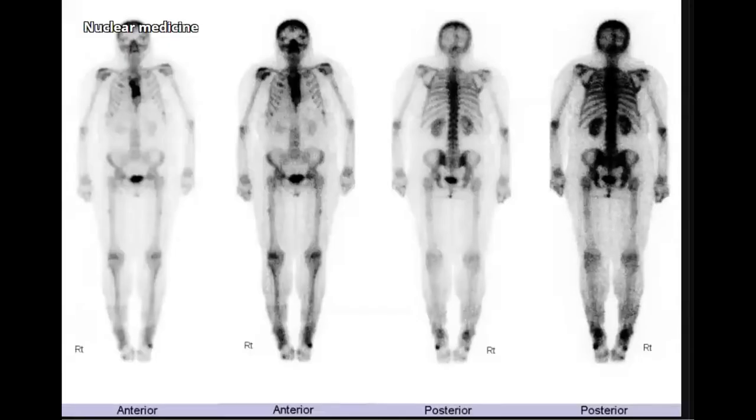Then the question for you: this patient has pain, and the history of this patient is that she has breast cancer as well. So you are worried, everyone is worried about malignancy, metastasis. Then where is the abnormality? Here in the bone scan, I would recommend you such a scheme.